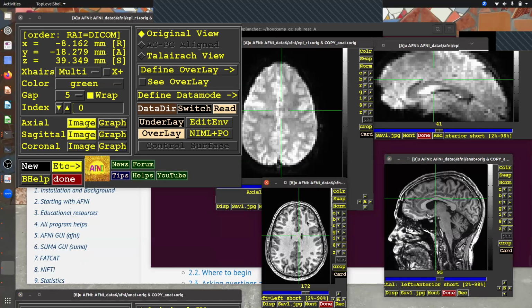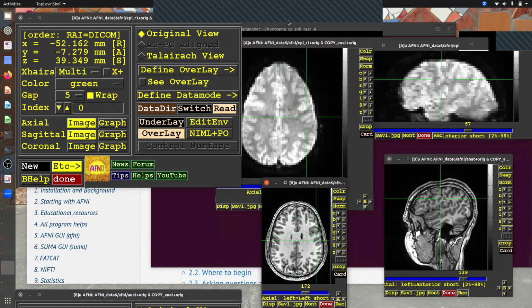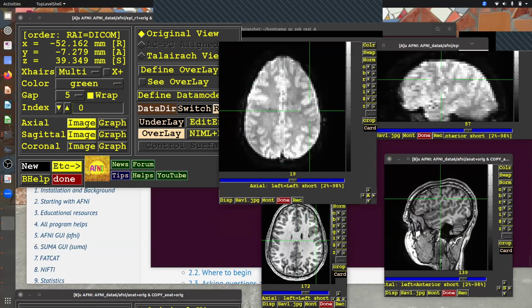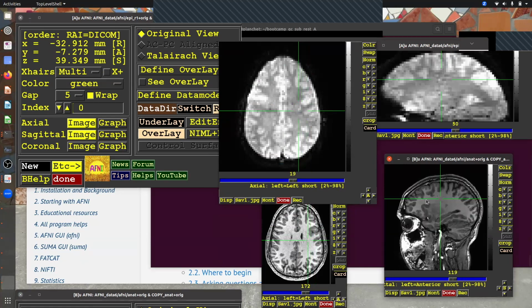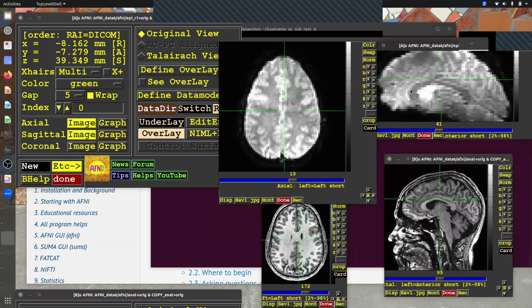So in this case, as I click around in the brain here, the crosshairs are locked, but immediately we can see just spatially, this looks a lot fuzzier. It doesn't look nearly as nice. If you saw this image walking down the street, you might be able to recognize them. This one, it's probably a little bit harder.